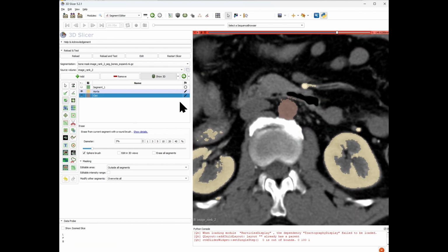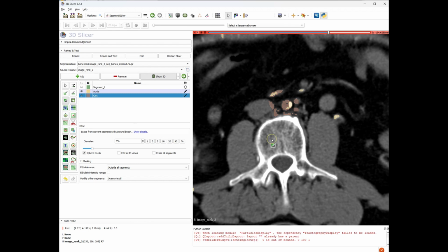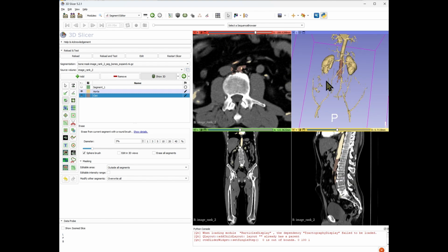So you're going to spend time refining this. And the other issue is making sure that it's separate from all of the bones in the back. Okay. So here it has some bones, so we can erase it. Once you are happy with the aorta, you're going to erase the renal parenchyma and show me the aorta and then how it connects to the iliac arteries.